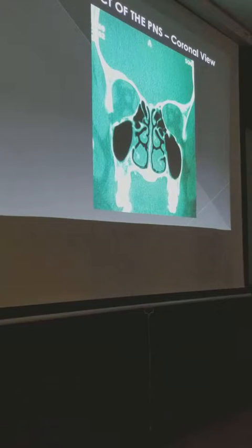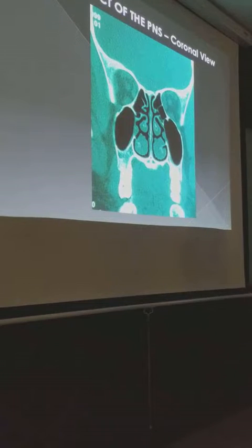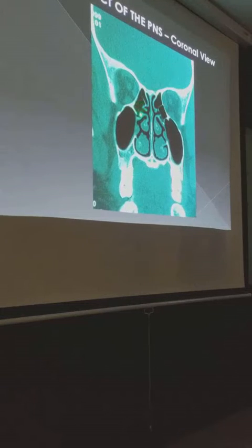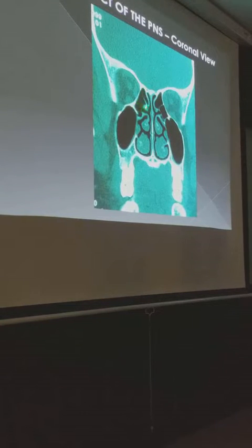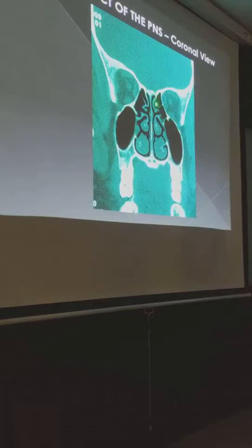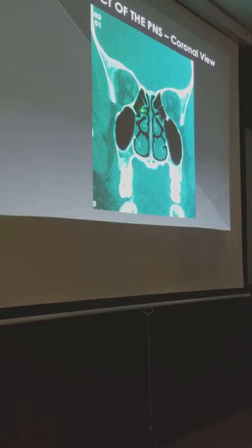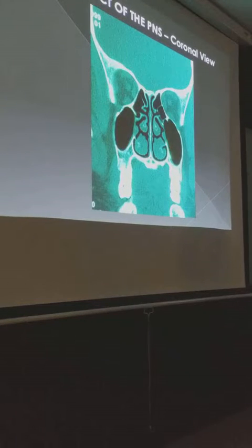Next slide, please. Okay. What lamella is that? Horizontal na. Okay. Flattened, thickened skull base. So I've promised you everything, I will show you. There. Okay. So that's the superior turbinate. So you expect the cells here, superior meatus, would be the posterior ethmoidal cells. Right? They're there, right? Okay? And this is your perpendicular plate of your ethmoid, of your perpendicular palatine bone, right here, maxillary sinus.